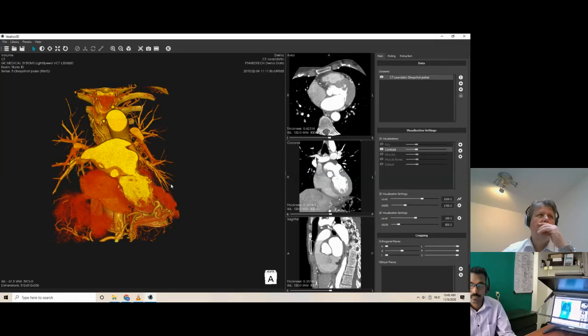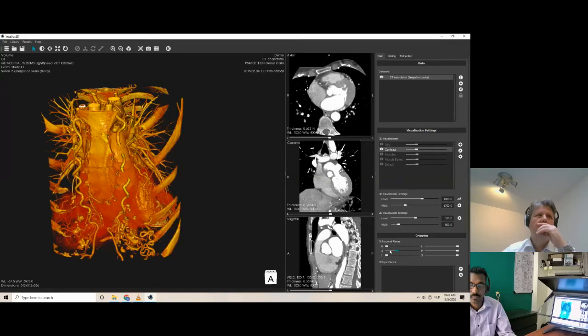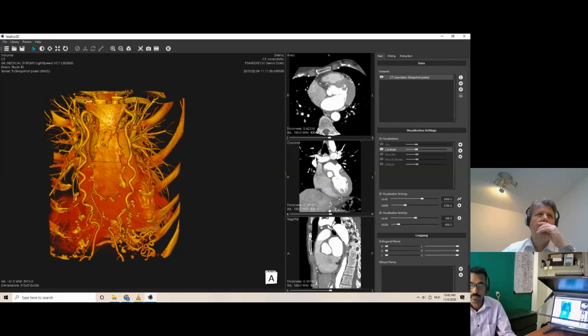But let me, because that's what this session is officially about, again, we're here all day to answer all your questions and we want to make it more interactive. Let me go to the 3D printing. We have a near field plane, which I want to get rid of. And I want to move here on the right-hand side, the cropping plane, I want to get rid of as well. So here we have the complete data set in contrast.